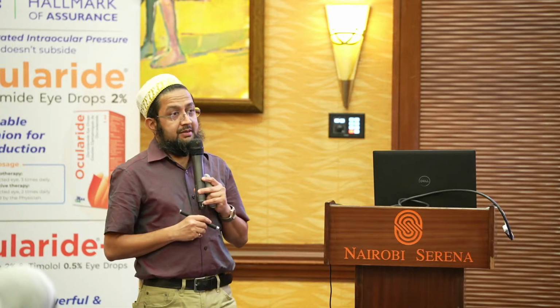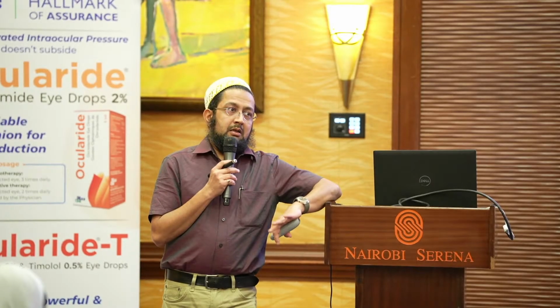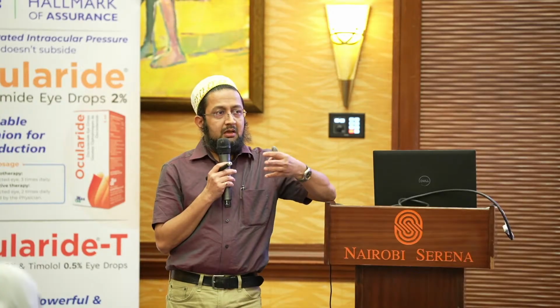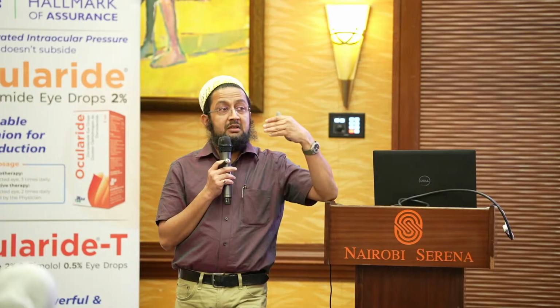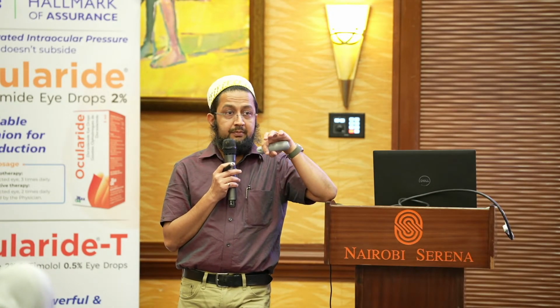Usually you get neuroretinitis. You can see here, this is a macular star with disc edema, and the same here. We had a patient 2 weeks ago in Kenyatta, referred with a diagnosis of an epiretinal membrane in one eye, the right eye. This patient is around 16 years old. When we examined him in the clinic, the left eye, the vision is very poor. If you look at the retina, he has foveal thinning in the center area. But when you examine the right eye, which was his better eye, now he started reducing the vision, we could actually see that he had retinitis at the macula and disc edema.